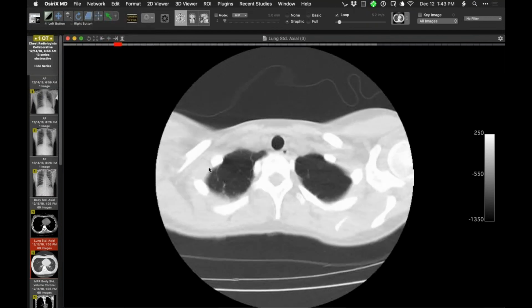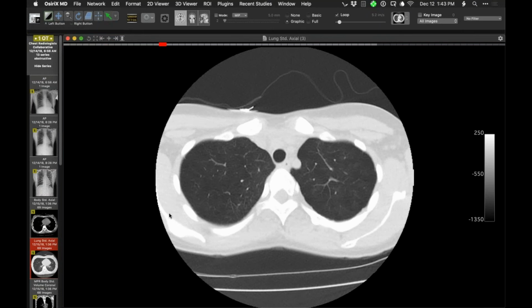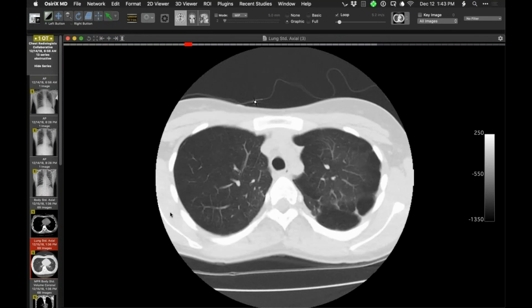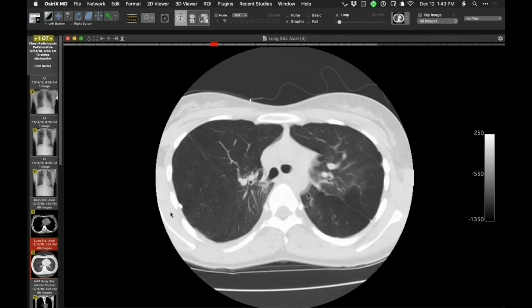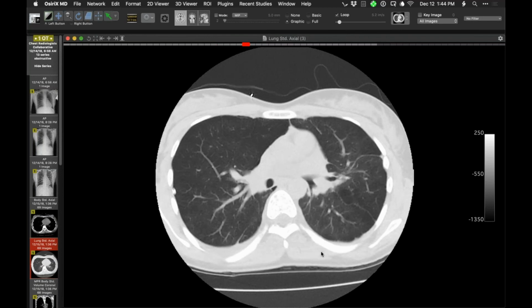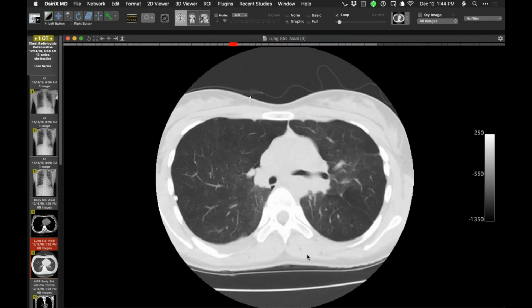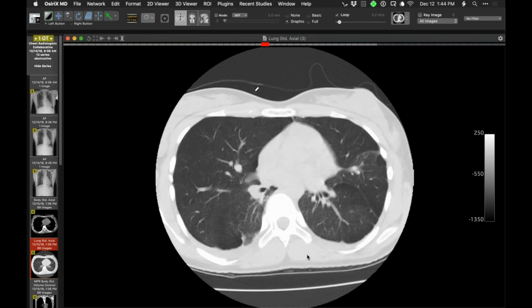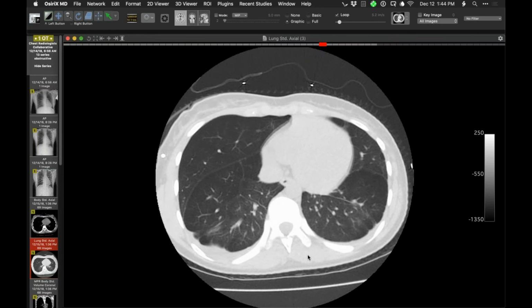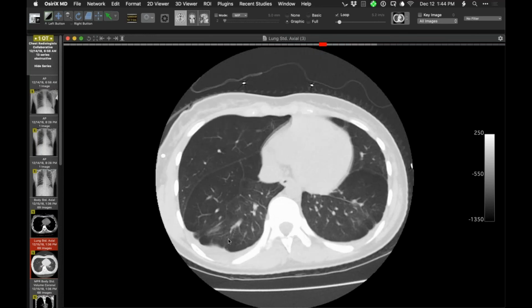So here is the CT. I'll scroll through that. And of course, we'll see the abnormal vessels, the attenuated vessels, the asymmetry of attenuation of the vessels, the areas of lung right here that really seem to be devoid of vessels. One should start to think, is it a primary vascular disease? Is it also potentially an obliterative bronchial disease with areas of air trapping? How much is vascular and how much is airway-related disease?